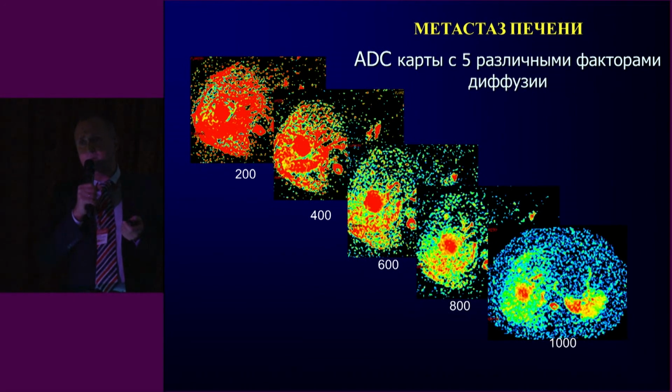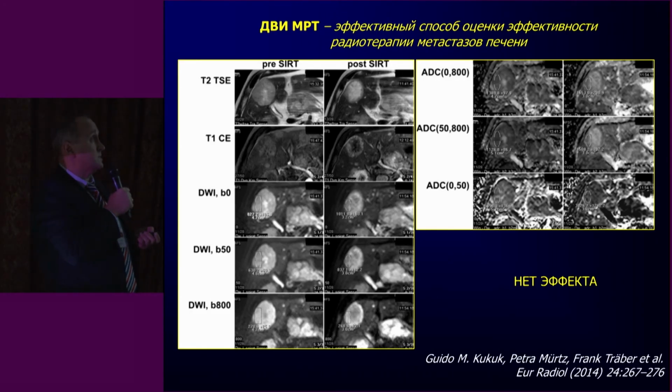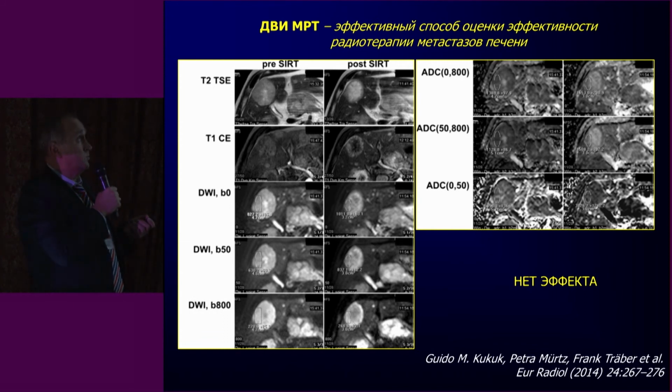It's actually to impress you, because color is used just to impress others, to make brighter articles. But for colorectal cancer metastasis diagnosis, we should do quite a labor-consuming examination, which with DWI could be done quite easily. We could use DWI to assess some therapeutic manipulations.